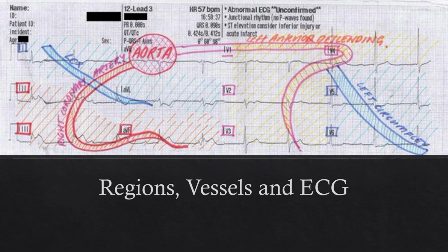So that's quite a checklist we have going, right? We talked about ST elevation, reciprocal changes, hyperacute T waves, ST shape, Q waves, STEMI mimickers, evolving changes, all those things. And so it can seem overwhelming to the novice provider, especially to keep track of all those things. But the good news is that it's all about recognizing patterns. And so there's really only 4 major patterns to identify because we have 3 coronary vessels that perfuse our myocardium.